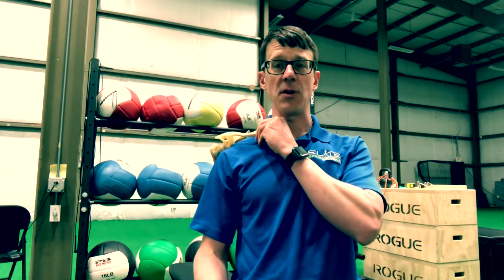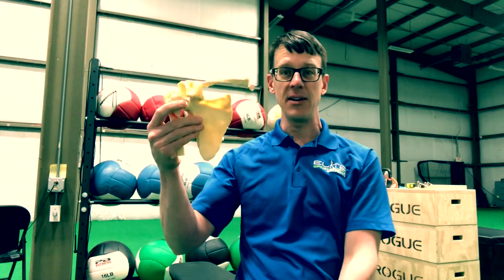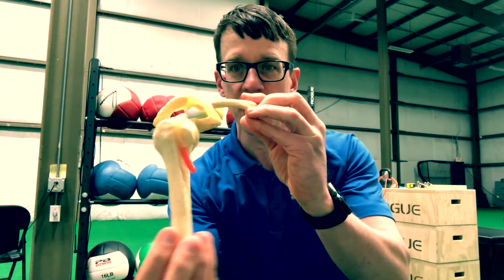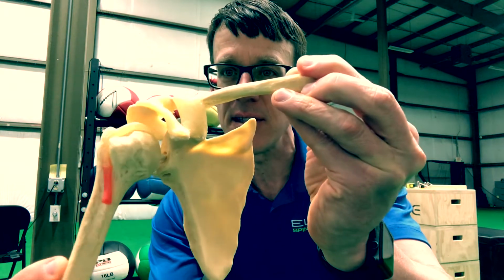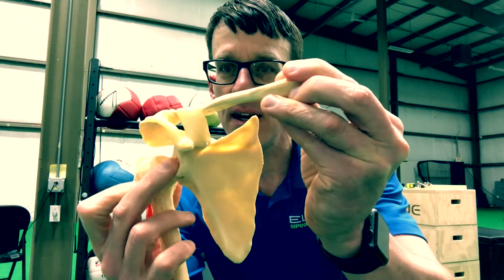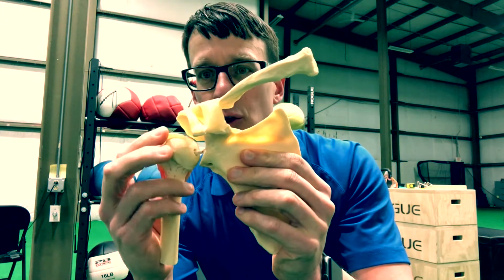If you conceptualize, that's my clavicle. This is like a right shoulder taken off the body or off the skeleton. If you look at it in 3 dimensions, that's looking at the person from the right. There's their arm swinging in the socket. That's the ball and socket joint that you could see right there. This is called your humerus. That little cup there is called the glenoid. So it's a glenohumeral joint.